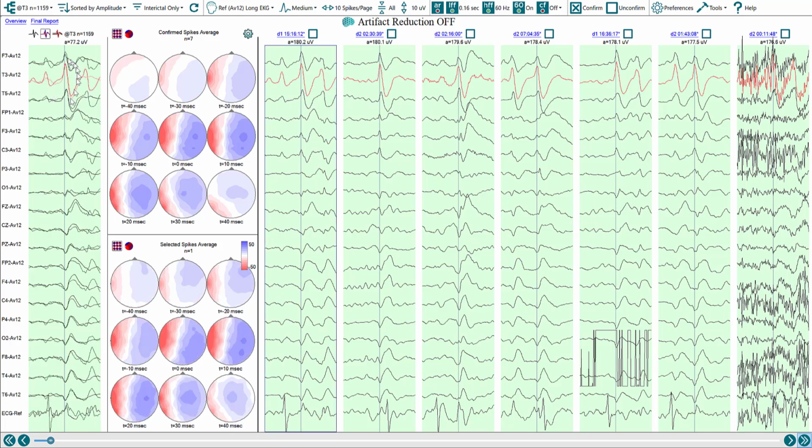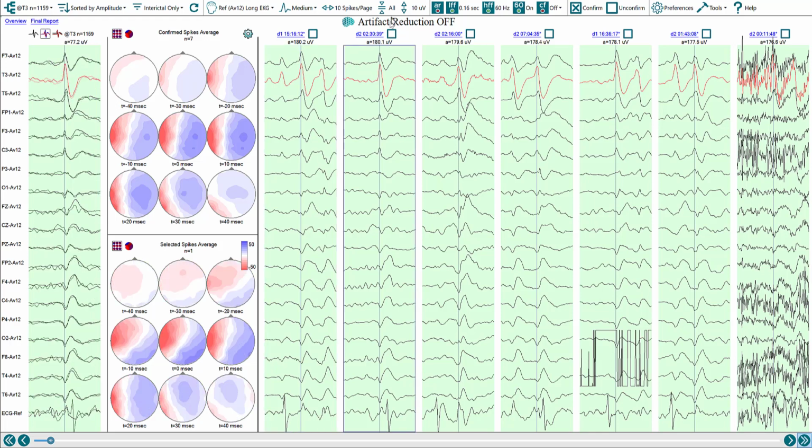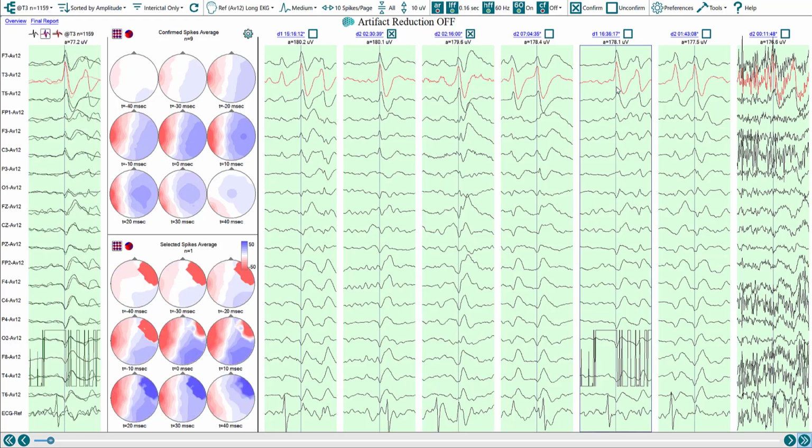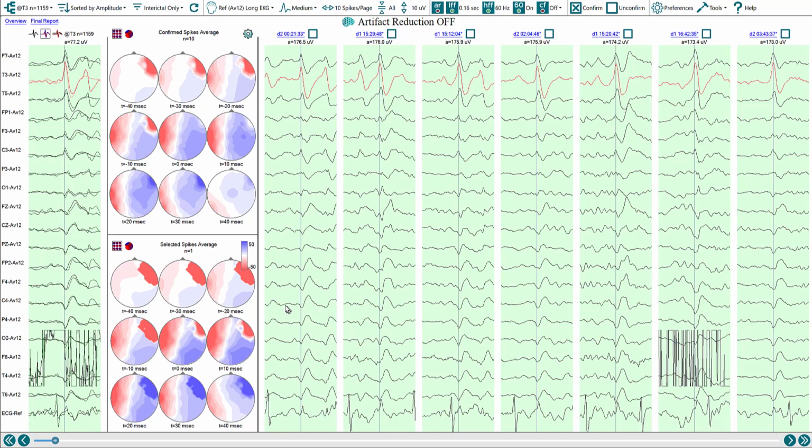And for this particular example, I want to look at that first half wave and get that nice and consistent for my average. And since there's quite a few spikes at this particular group, then I can afford to be picky.